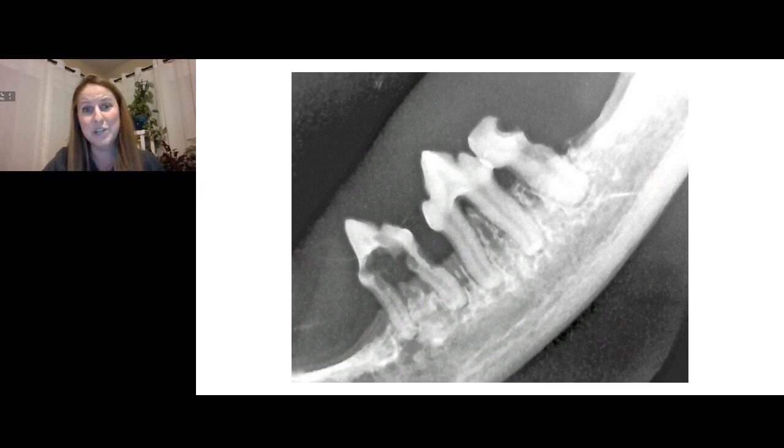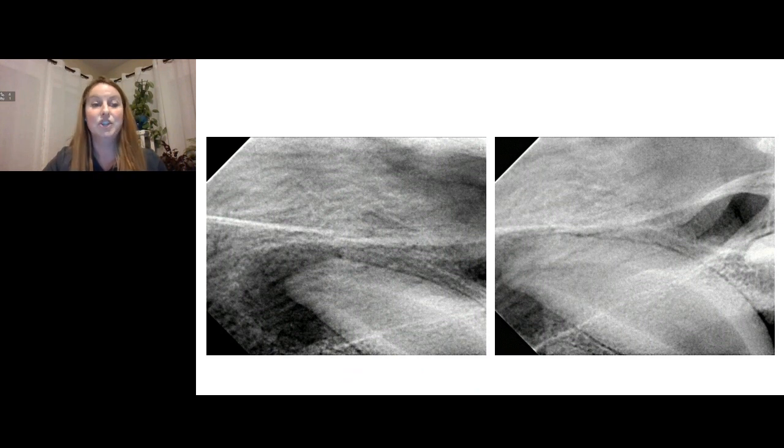Here we have more tooth resorption in cats, another mandible, right? So this is going to be our type 1 tooth resorption. We have focal, multifocal, radiolucency, intact periodontal ligament space. Take these teeth out completely and take a radiograph to show that you did. This is showing you on the right here, we do not have a diagnostic radiograph. Why? Remember I said 3 millimeters around the apex, that periapical region. Why does that matter? Look over here. Oh my goodness, we have the biggest periapical lucency. So super important. We would have totally missed that if we didn't have a diagnostic radiograph. I know these radiographs can be hard to get sometimes. So just making sure that we are getting all of that region around the tip of the root of the tooth.